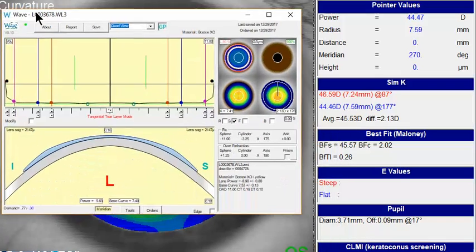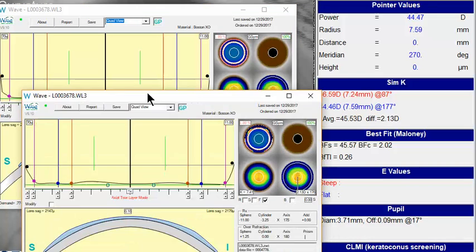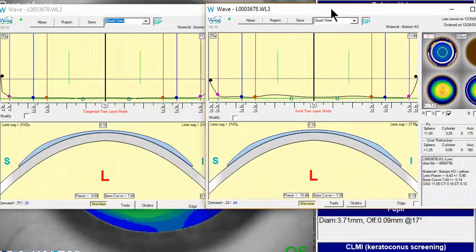So I've got your third design here, and if we look at that base curve and that vertical meridian, you're at about 740, and 740 both superior and inferiorly. So one way to do that is if you switch over to axial, which will give you a little bit more general steepening of the lens, and switch over to freeform. I designed a lens in that modality here just so you could take a peek at it.